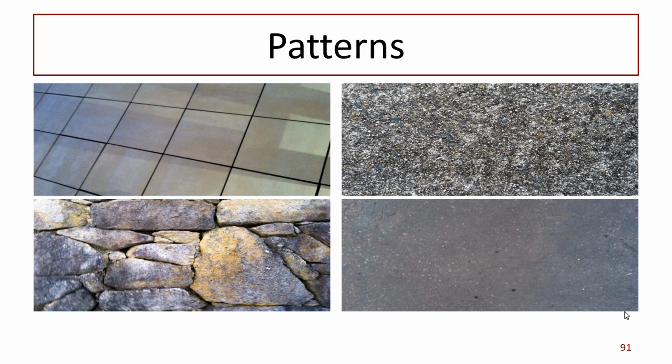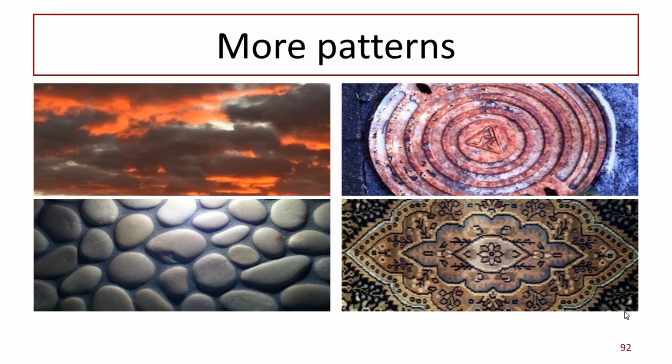So here, to remind you of the patterns of nevi. We've got a reticular pattern, a dotted pattern, a clod pattern, and a structureless pattern. Okay, which is the melanoma? Top left. It's easy, isn't it?